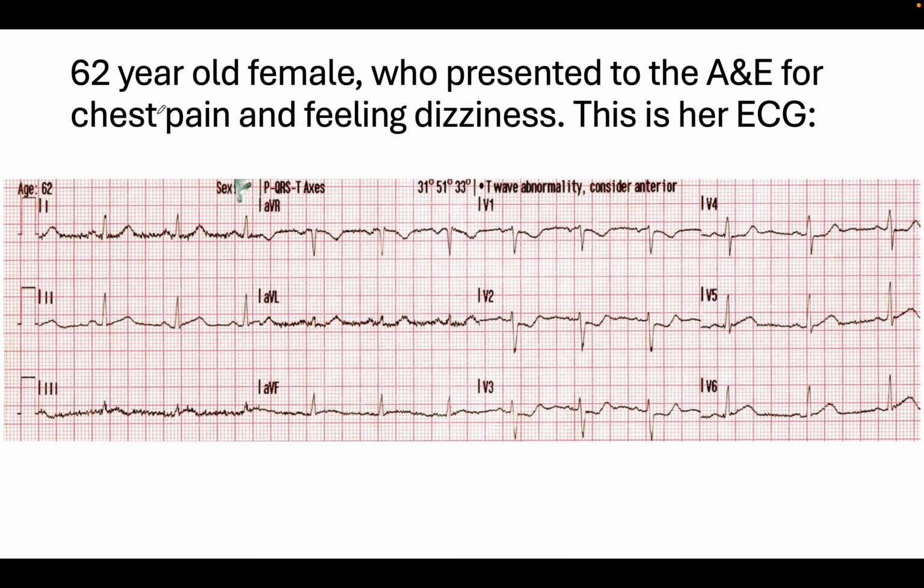So next ECG, a 62-year-old female who presented to the A&E with chest pain and feeling dizzy. This is her ECG. Feel free to pause the video and work it out. So let's go through it.